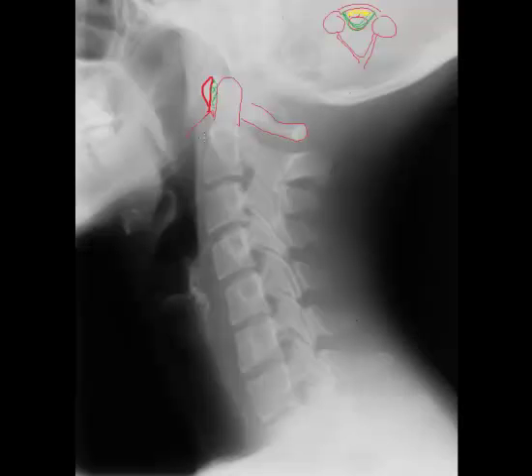To continue on with the anatomy, here's the C2 body. I'm just going to switch back to red, which I think is more easily seen here. Vertebral body. Now remember in the cervical spine that the transverse processes extend from the body laterally, and it's a U-shaped structure. This structure is going to be visualized within the vertebral segments. You cannot tell right from left as we have no depth perception, but we can see the U-shaped density of the transverse processes. I think it's important for us to understand the order of anatomy from front to back.